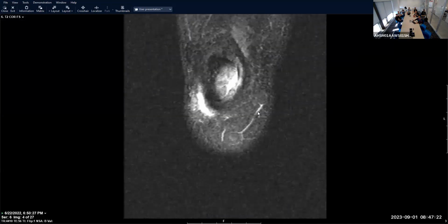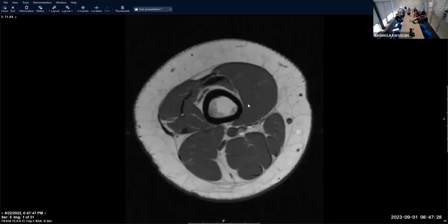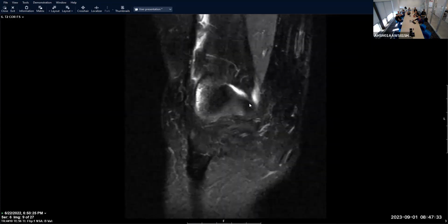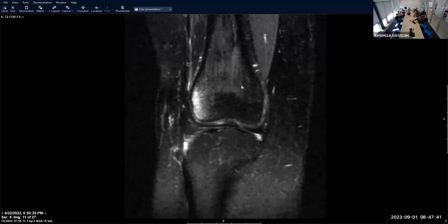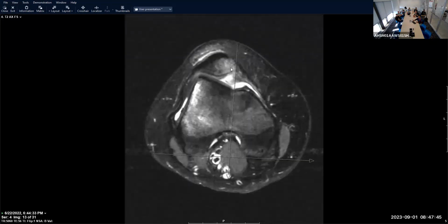Patella impaction deformities you'll see nicely on these coronals, particularly the coronal T1s. If I'm looking for any cortical defects or abnormal morphology, we don't have T1s on this plane because it's our old protocol, but I like to go far anterior and see if I can see a little triangular defect here, to see if there's an impaction fracture or if it's just a contusion. I'm interrogating the inferomedial patella, usually.